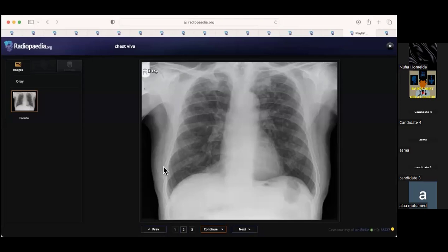So my interpretation for this case is reticulonodular shadowing, without any bony abnormality. No rib crowding or expansion between them. The lung apices are very clear, and there are no lesions seen in the skin of this patient. So I will communicate my findings to the referring doctor.